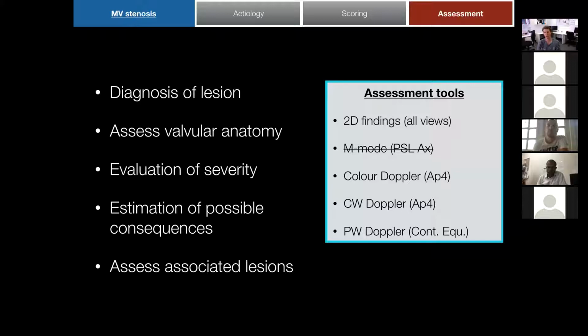I'm going to leave it in there. I'm going to show a few things because I think it's a bit geeky and kind of cool. I like M mode, but also the ASE exams love asking about M mode. I think they go under the premise that if you know M mode, you know echo. So it's worth it, I'll show you a couple of pictures and we'll talk through it.